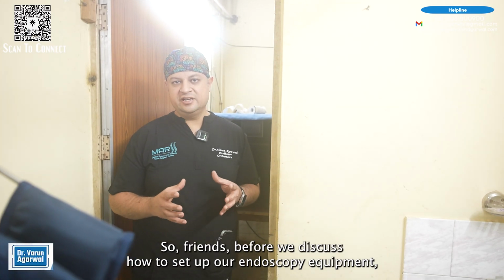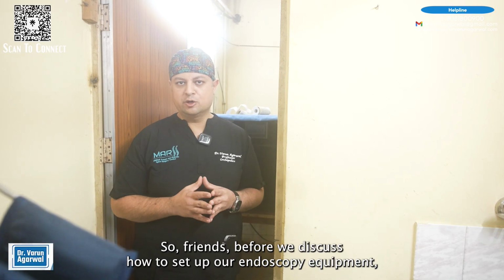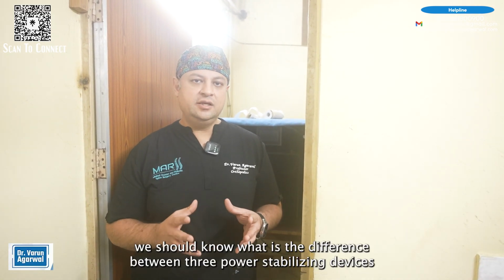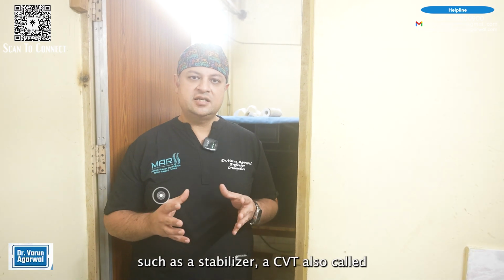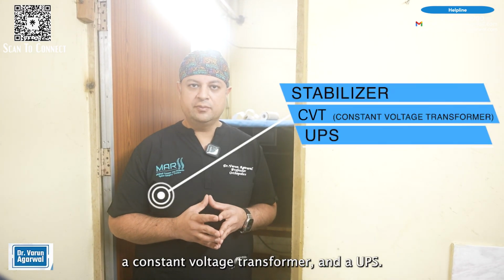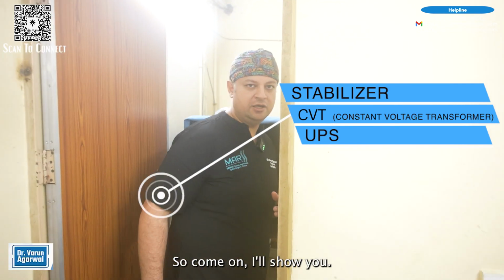So friends, before we discuss how to set up our endoscopy equipment, we should know what is the difference between three power stabilizing devices such as a stabilizer, a CVT, also called a constant voltage transformer, and a UPS. So come on, I'll show you.